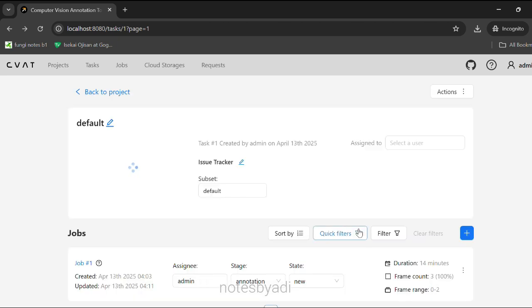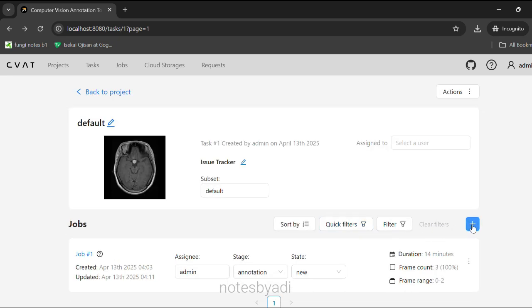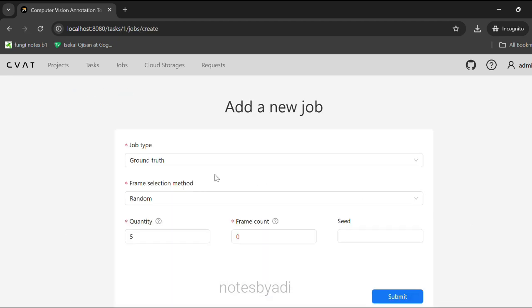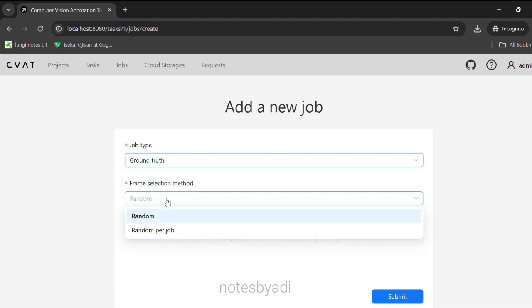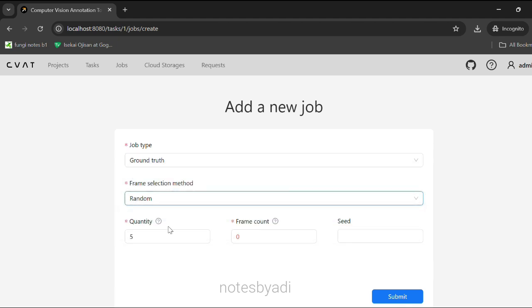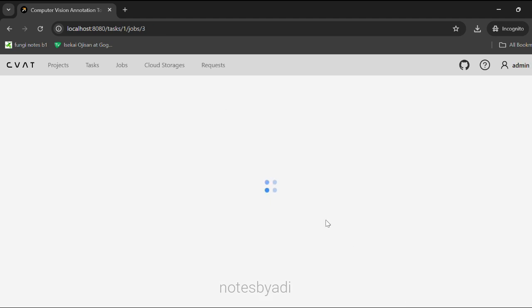An extra feature that I also explored in this platform was randomly shuffling the task of annotation in smaller batches, either to assign to somebody or tackle the annotation project gradually on your own. This is quite a useful feature. I shuffled just for the two images and it naturally gives me a small task to tackle.